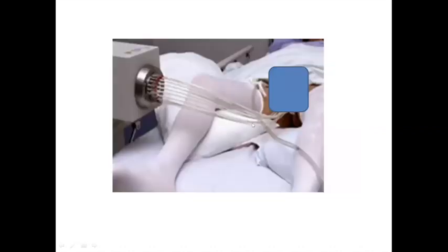And then decency protected with a little blob over the relevant region here on the final image. So this is what it looks like when the patient finally gets to the cancer centre for the brachytherapy treatment. So they've woken up from their anaesthetic. They've had a CT scan and an MRI scan. And myself and the physics team have done all the voluming and planning together.